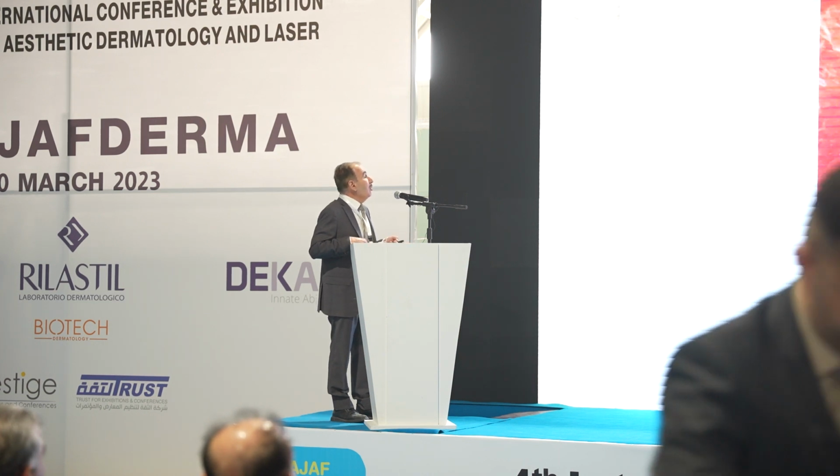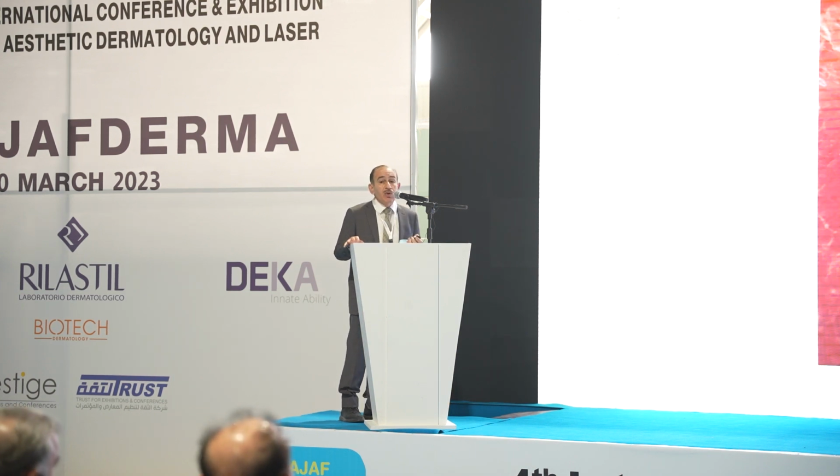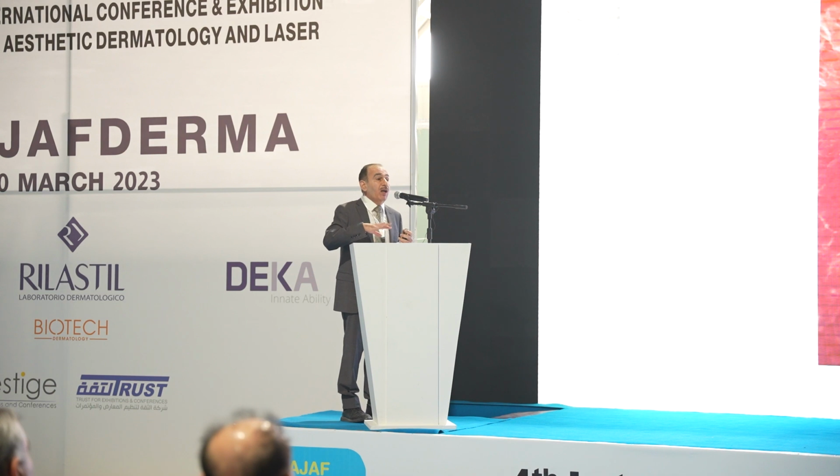Now, let's take a look at, this is also dots and globules, but here, the dots and globules are not uniformly distributed. And we said to diagnose psoriasis, you have to see the dots and globules uniformly distributed. But again, here is an important thing about the dermoscopy. You have to take the whole picture. I mean, if you have an area which is the dots and globules are uniformly distributed, you go for it, and you forget about the non-uniformly distributed.